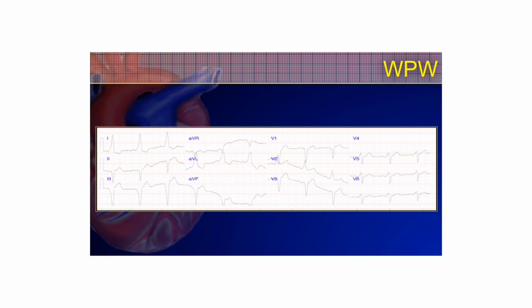Here's one where the actual 12-lead EKG tracing is not as clear. This is what we would call a wandering baseline. This patient probably had some severe dyspnea or something, was moving around a lot. But what you can gather from this, just by looking at lead 1, is that the patient has WPW. Shortened PR interval, slurred upslope, wide QRS. This QRS complex is much wider than the previous one that we saw.